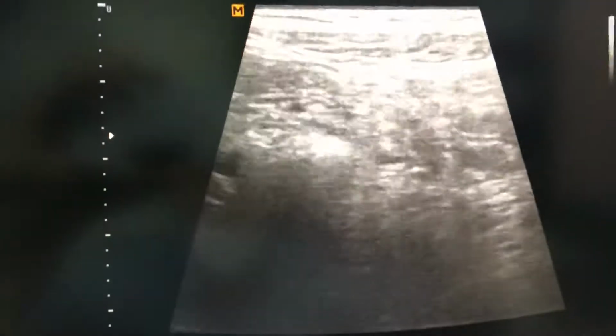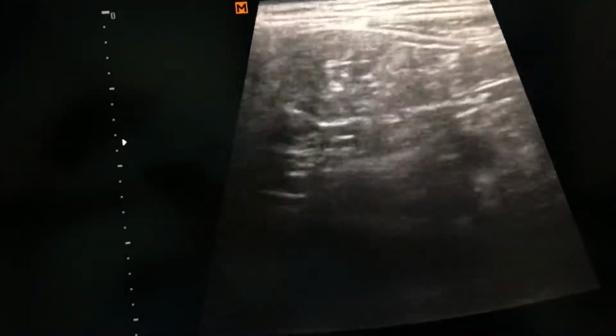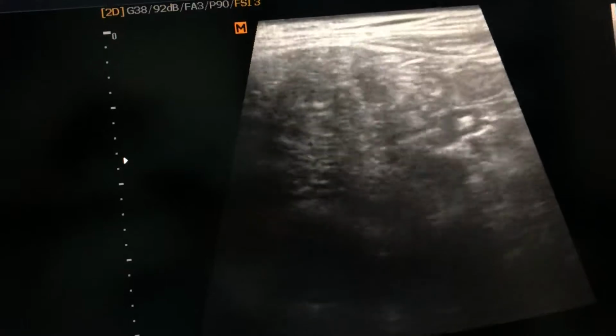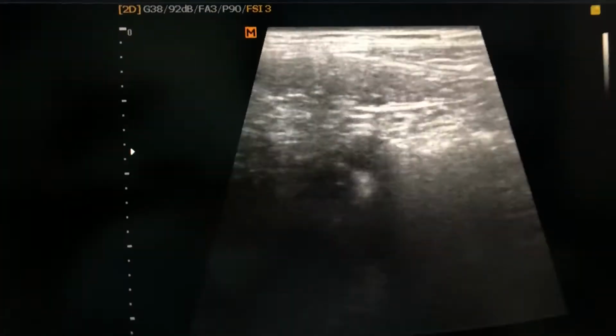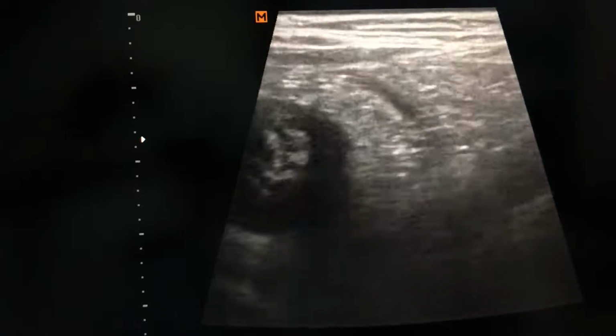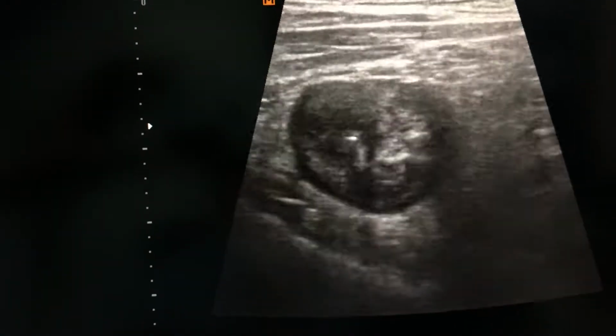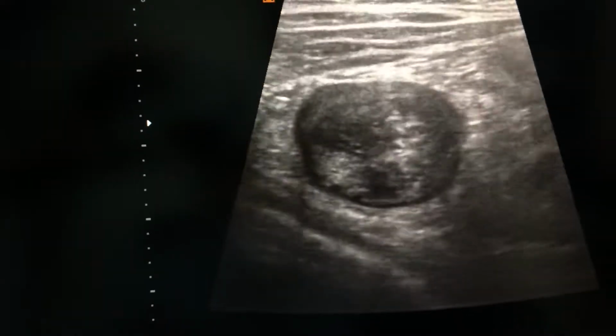This is a 15-year-old female patient complaining of pain in the periumbilical region since 1 month, with a 5-6 day episode of fever 10-15 days before. Pain is since 1 month, and it is a case of appendicitis with thickened cecum and ascending colon.